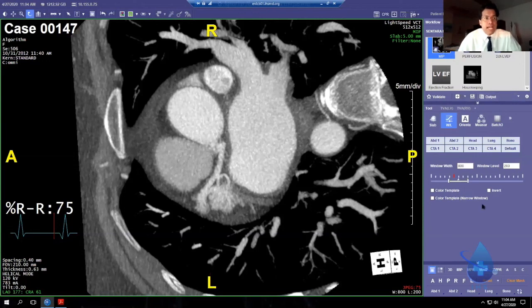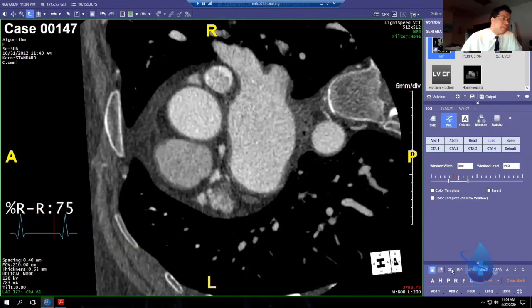The last 3 buttons on the screen, and then we'll talk about the mouse. The last 3 buttons are right here that you need, and everything else you're not going to need on here. There are some buttons that might be nifty, but this is all you need to learn to read: 3D, MIP, and MPR, okay?